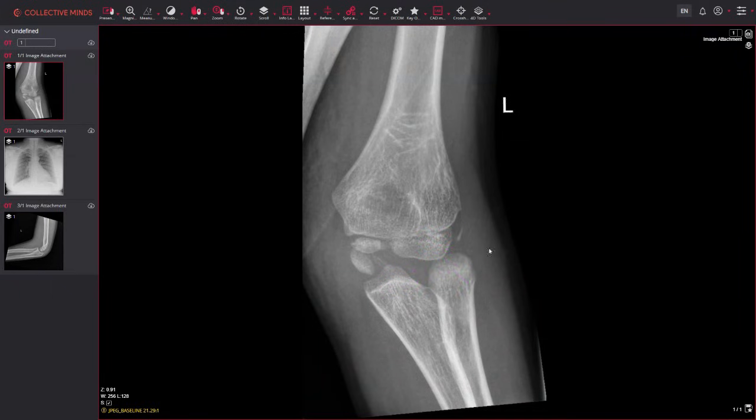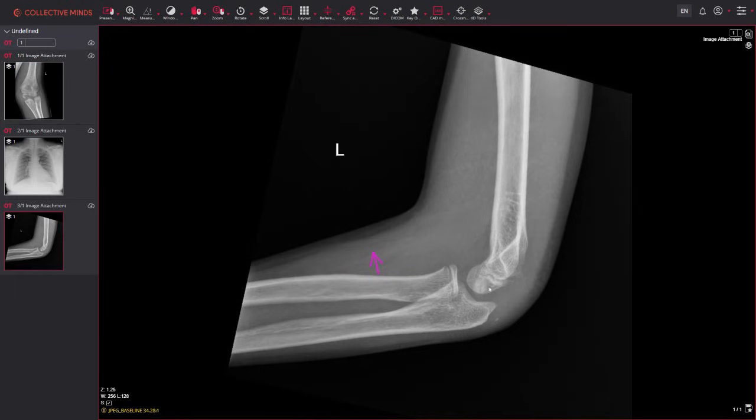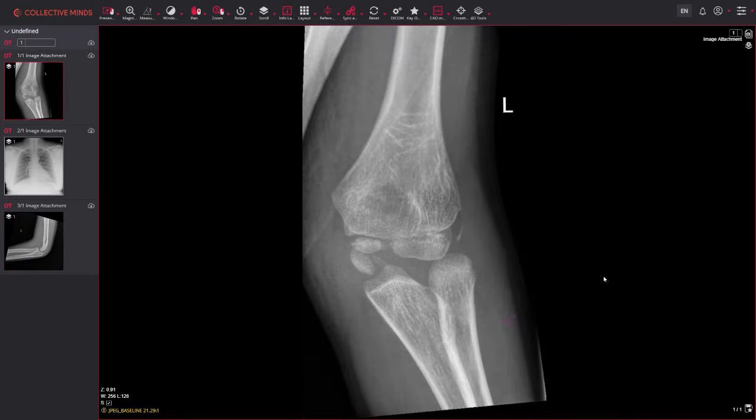Then that's followed by the radial head, around 4 to 5 years, we have the medial epicondyle or internal epicondyle. Then there's a little bit of a gap to 9 years, but then we have the trochlea, which is here, and the olecranon here start to ossify. And then finally, at 11 years, we have the lateral epicondyle.